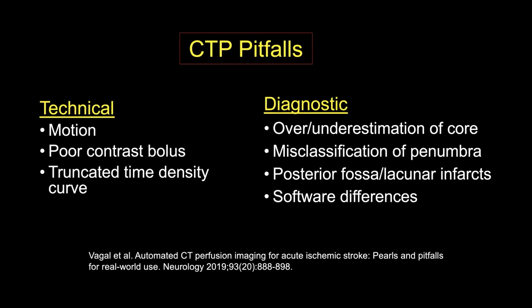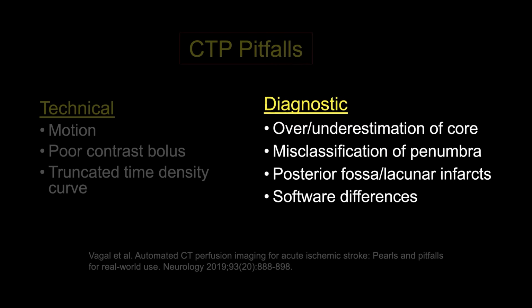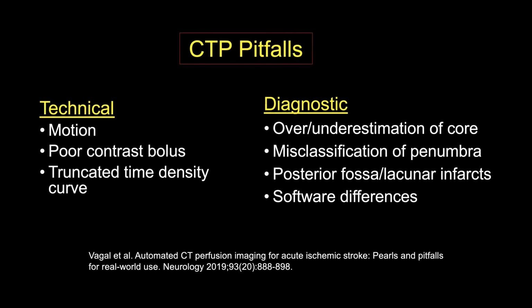Remember, some of the things that we looked at was, here is a great summary map, and almost the perfusion software is telling me everything that I need. But just like with any tool, there are going to be pitfalls. So for CTP pitfalls, I like to divide them into two categories. One is technical and the other is diagnostic. And we'll look at both of them. So let's start with our technical pitfalls.